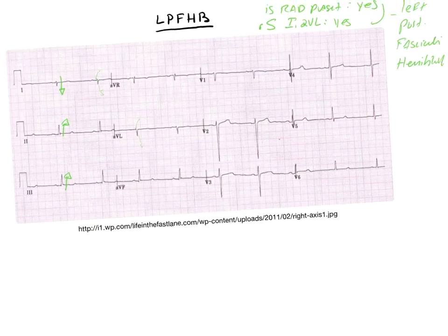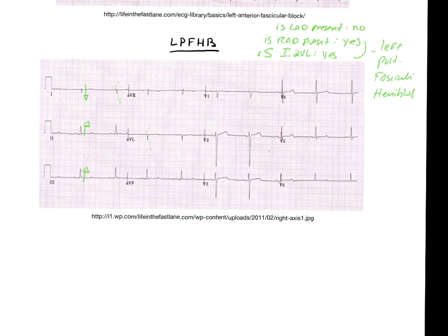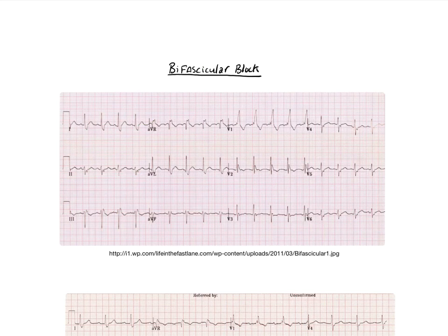How crazy is that? I don't know, I get a kick out of being able to identify these kinds of things. Okay, moving right along.